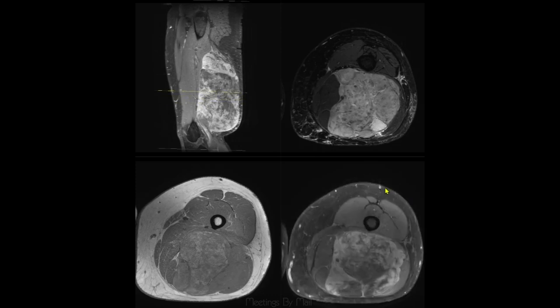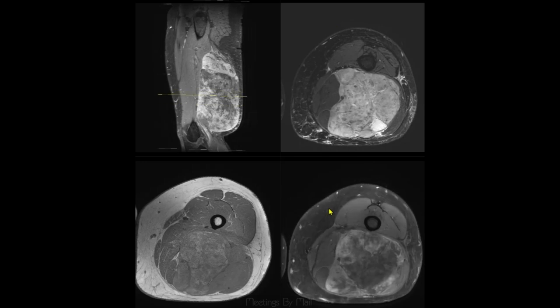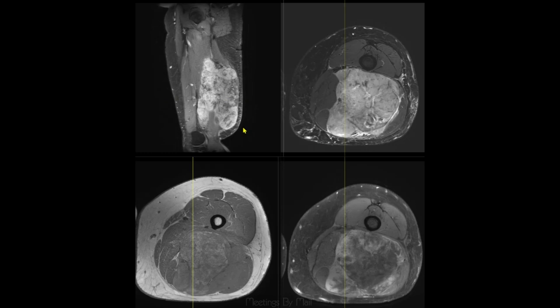The borders and the shape. The shape is important in this particular lesion. It has a kind of an odd shape to it, but it's almost ovoid. But I want to give the fact that the borders are mostly well defined, except for an area that's not. And I would say a small area posteriorly may not be well defined.